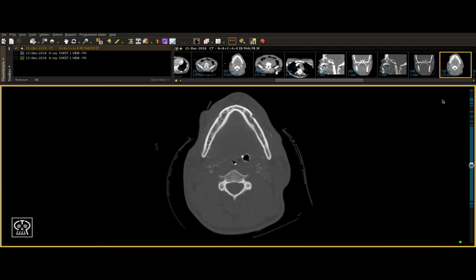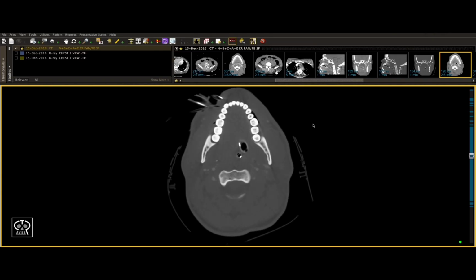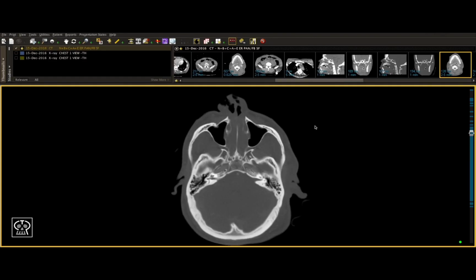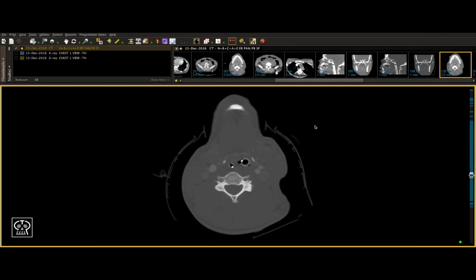Here you can see on this viewer, they display the millimeter cuts at the bottom of each image. I just want to show you what a 2.5 millimeter cut window would look like. Scrolling from the mandible to the maxilla, you can see how wide the cuts are and how much information is skipped over between each cut. In fact, scrolling through the entire scan is very quick because the cuts are so wide.